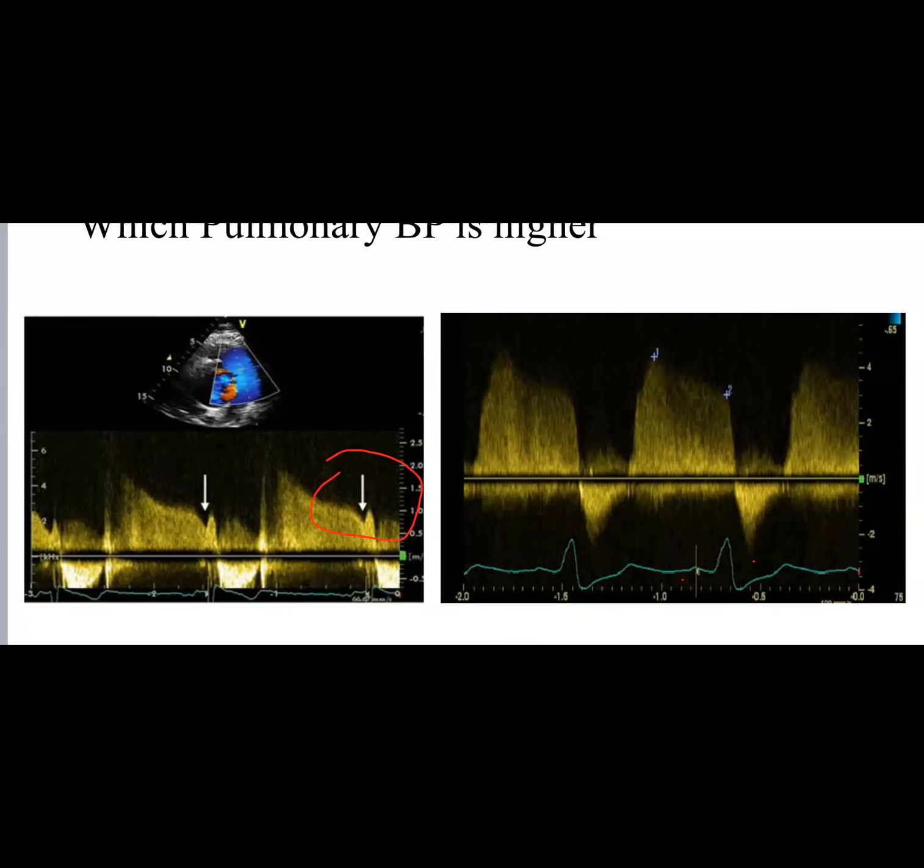Okay. Look at this one here. These are diastolic pressures. They are higher than in here. Does that mean anything in terms of which diastolic pressure is higher? Yes. The second one. The right one. Exactly. So first and foremost, the higher the signal is, the more diastolic pulmonary pressure, so the more pulmonary hypertension. So the one on the right tends to have more diastolic pressures. So I'm expecting more pulmonary hypertension on the right, and we are right.